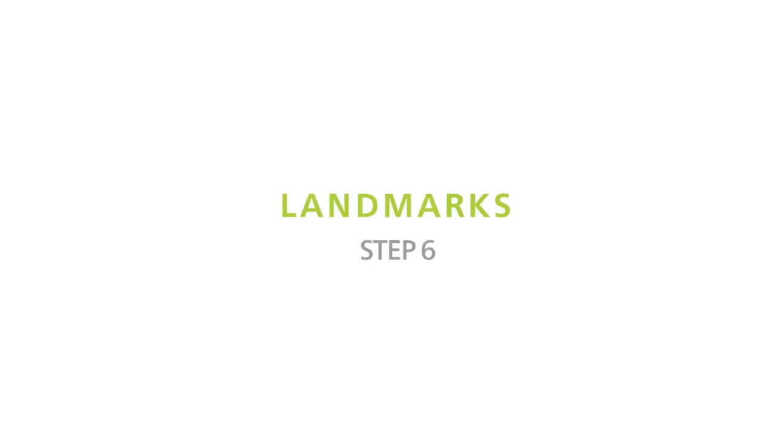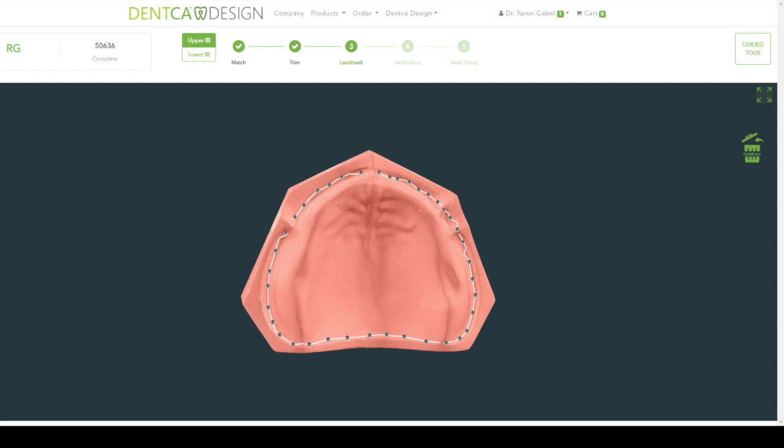Landmarks. The landmarks consist of 3 upper points and 2 lower points. Please select the incisive papilla on the first upper landmark, red. Next, choose the left and right hamular notches, green, as the second and third landmarks. It is important to ensure that the landmarks are placed within the trim line.